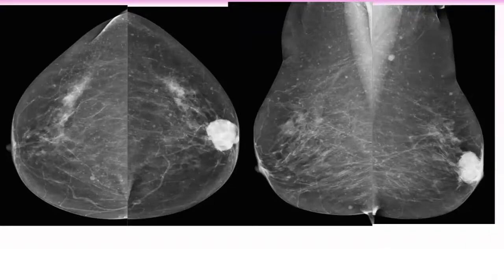Only both breasts? Even the axilla, maybe they are just artifacts. I told you no artifact; they are real and seen on ultrasound. Could they be skin lesions like sebaceous glands? No, not the skin. They are seen subcutaneous and within the parenchyma.